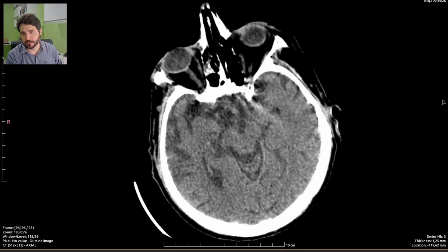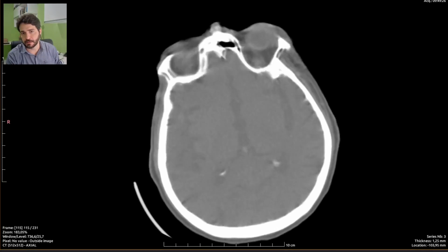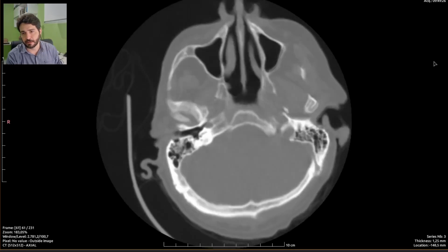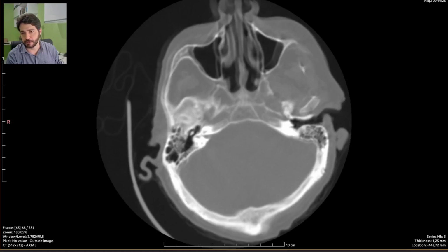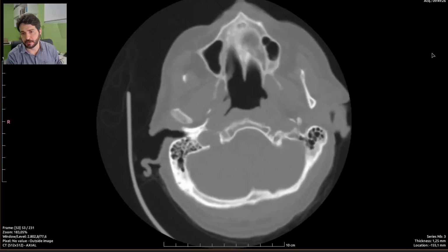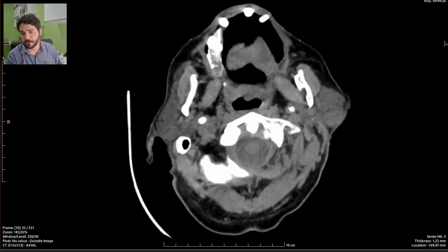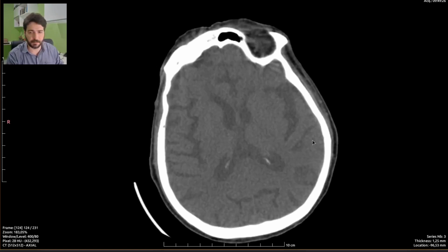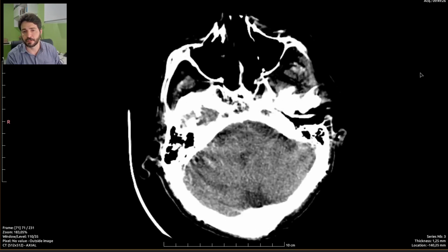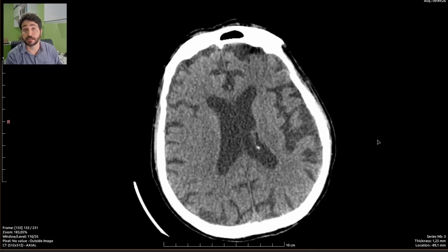And this is it. Let's check the eye sockets, which are terribly scanned, and the petrous bone, temporal bone. So it's, as much as we can tell, it's okay. So this is just an old man's brain, nothing major, and in comparison to last time's exam, it's really the same.